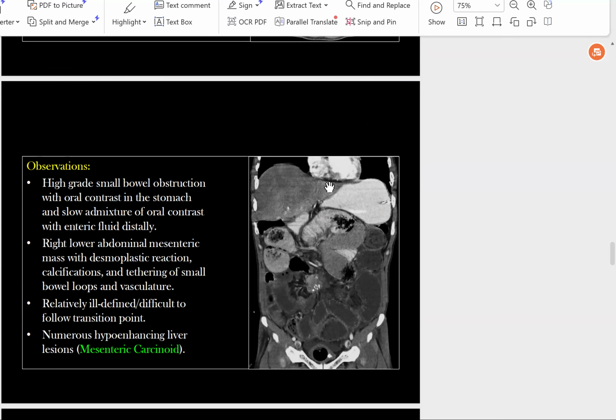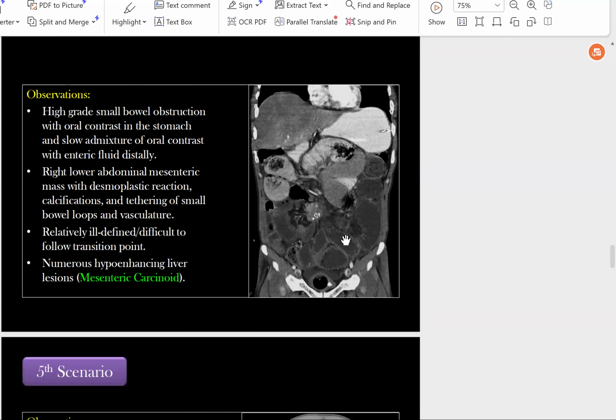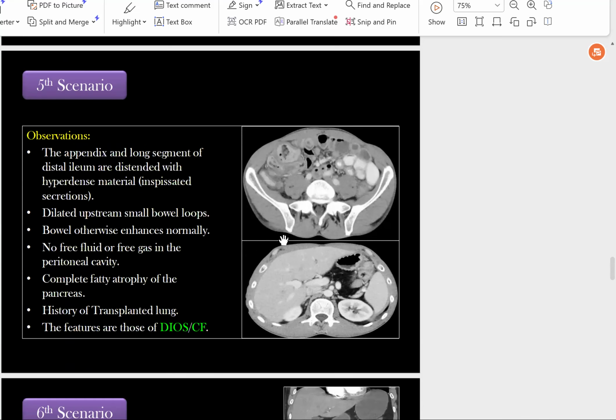Very important to mention, I will assess the liver, especially in the arterial phase, and I will ask for nuclear imaging and also assess the small bowel for any enhancing mass lesion and ask for endoscopy. Because primary mesenteric, primary ileal carcinoid is difficult to be imaged or detected by CT scan, but it can be detected by endoscopy. So endoscopy is indicated in these cases.